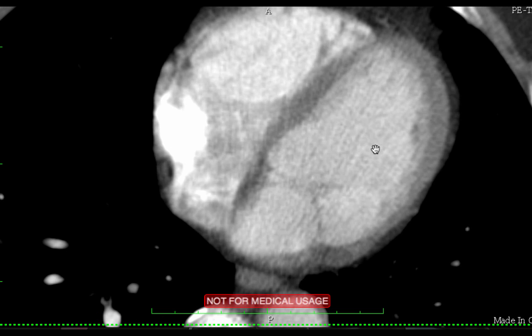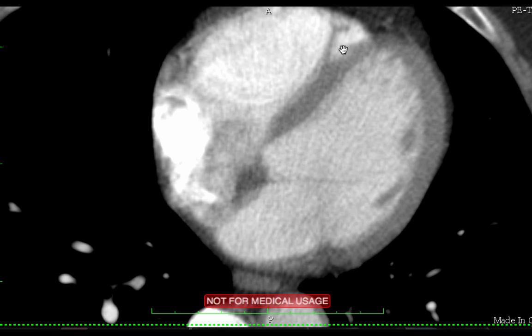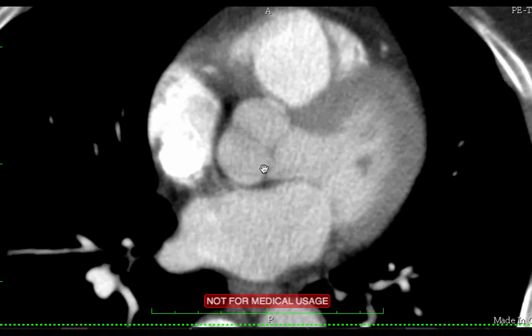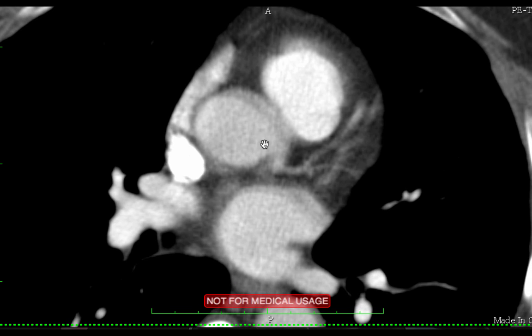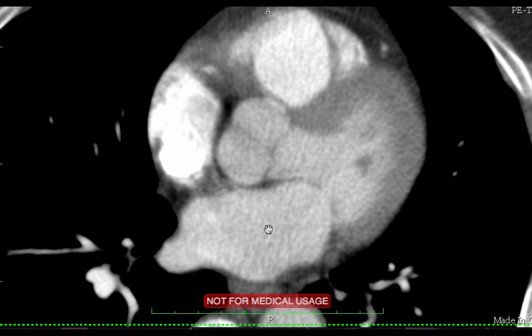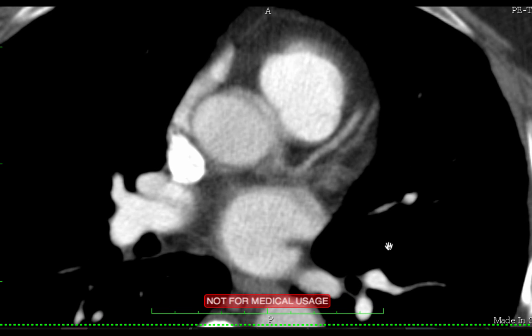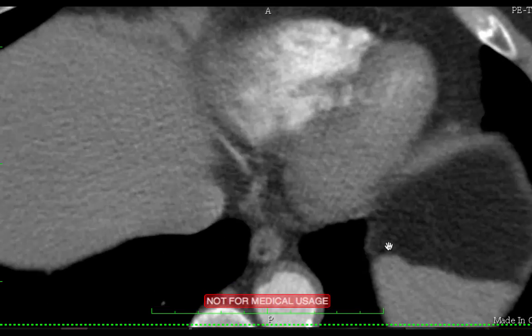Once you get used to this and see left atrium, left ventricle, right atrium, right ventricle, interventricular septum, interatrial septum, papillary muscles, chordae tendineae, mitral valve, and aortic valve, and right coronary artery, and left coronary artery with the left anterior descending heading off this way, and the left atrium with the pulmonary veins coming into it, you can intuit the mediastinal structures. Okay.